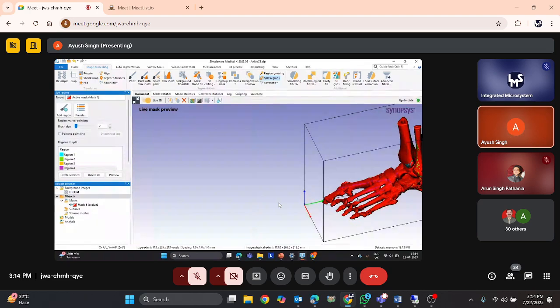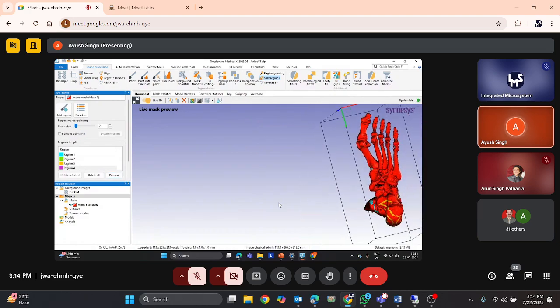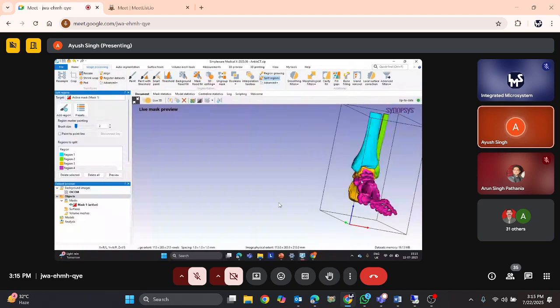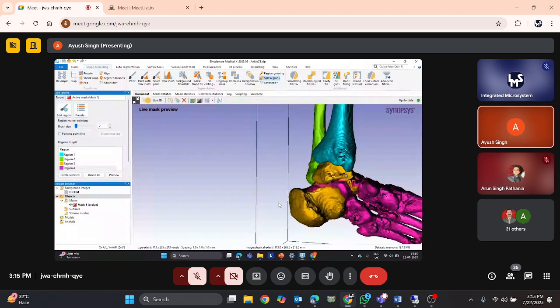I have shown this in a very brief way, but when we get more familiarized with the software, we can use this operation in a much more detailed way. Now, to check a general preview of how the software has marked the different regions, I can just click on the fast preview option to generate a preview. Once we have generated a preview, we can check how it has identified the different regions. If it has marked some boundaries of the foot region with the ankle incorrectly, we can again mark the boundaries over here, marking the different regions, so it gets separated out.